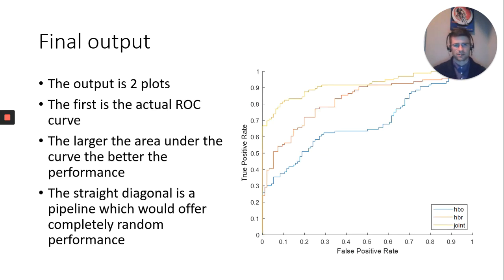The graph of interest, though, for most people is going to be this ROC curve. I hope this was helpful, and I hope this gives you all the insight you need to both understand what this is doing and also helps you actually implement it in the NIRS Toolbox. Again, the main use I can see for this would be comparing pipelines. It's not necessarily perfect. You're simulating data. You're doing your best with that, but it's a very good way to dictate what kind of pipeline you might want to use in various aspects.